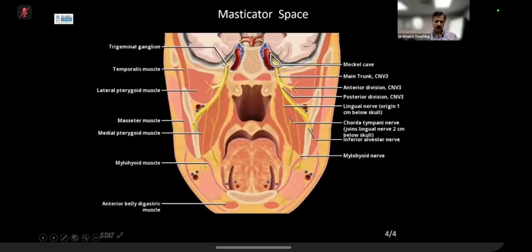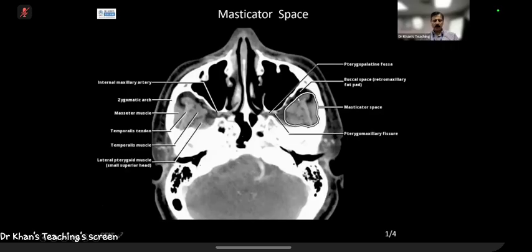Once again, this tells you the V3, which passes through the foramen ovale. So on CT scan, and please remember, these kinds of cases are extremely important for the exam. Because of time factor, I might not be able to show you DICOM images today, but I've got a few in my collection which, as a practice for your 2B exam, I'll show you.